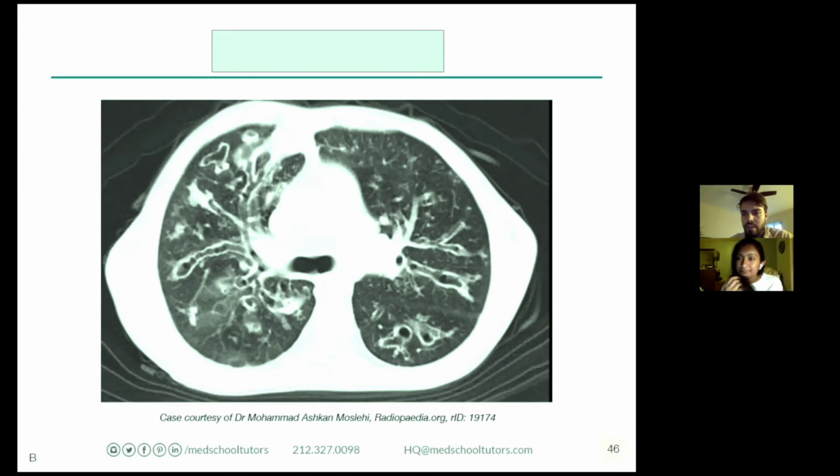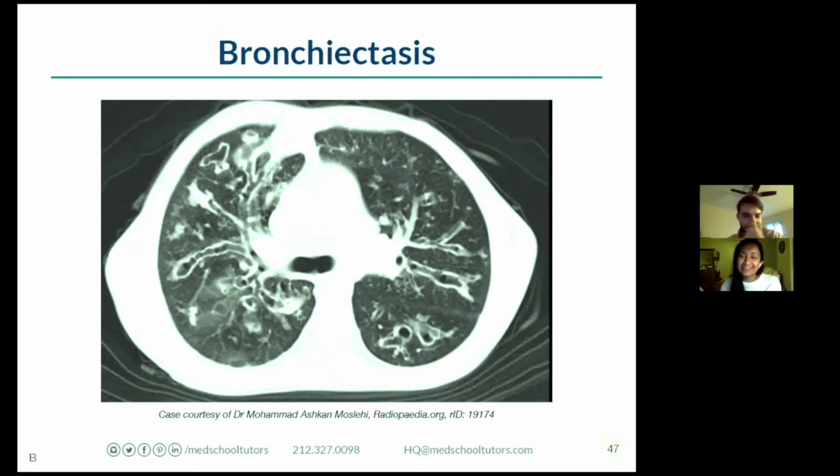We got a lot of the right answers. Everybody's got this one. As Sana said, maybe we have to make it harder for you guys. Too easy. Perfect. So exactly like I said, we see these very, very prominent bronchi. And like Blake mentioned earlier, you should see tapering. In normal anatomy, you see this main stem bronchus, and it gets smaller and smaller. Here, this does not look like it gets smaller at all. You should not be able to see such clear, large vessels or bronchi so far out.